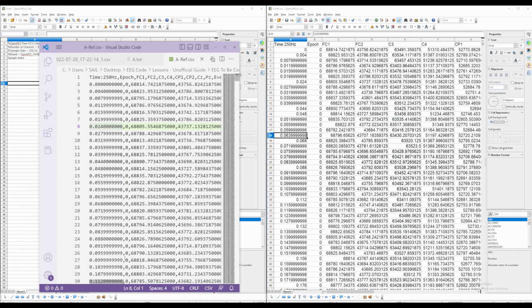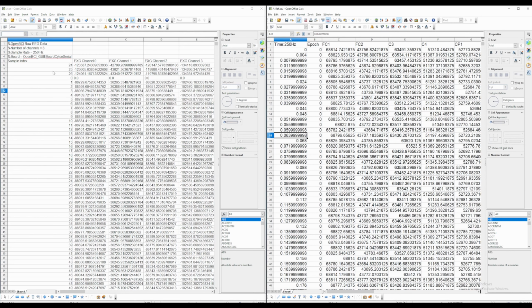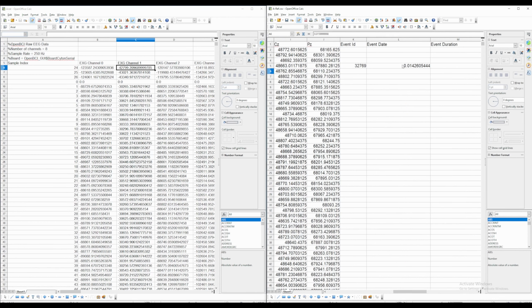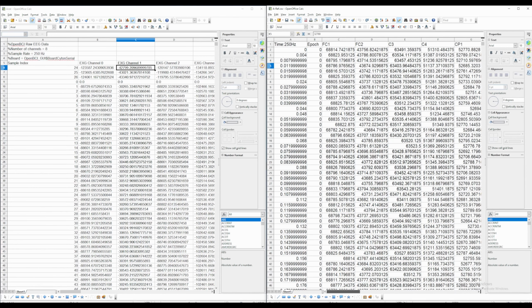And a lot of times you'll see in CSV files that they do this because it's better to have the same number of characters if you're dealing with a text file. So for example, if you know that your first column is always 10 characters, you'll know that you can just go 10 characters forward and reach the end of the first column. So it's useful for automation and scripting later on. But here we're making our file from scratch, and the goal is to get this file A and make it look like our reference file, aref, minus the markers, which are subject for another tutorial.